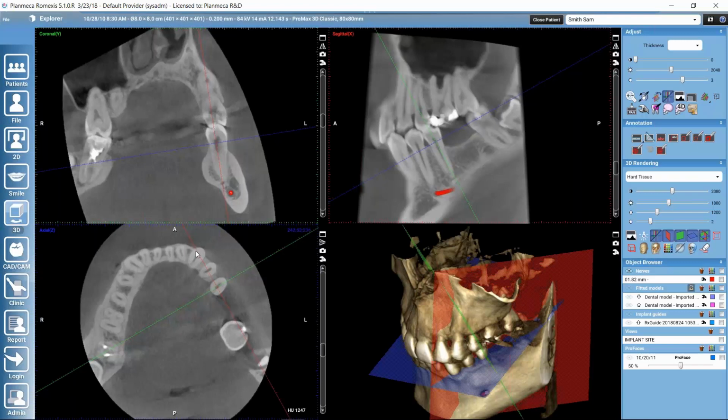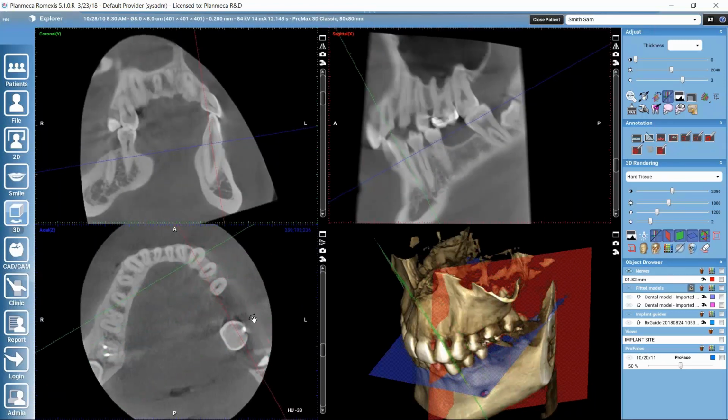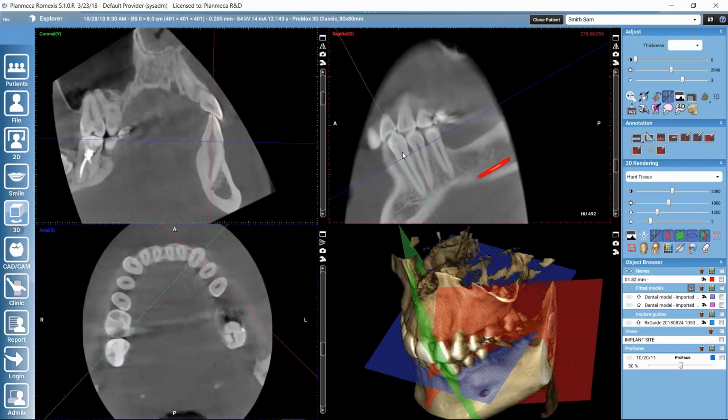So firstly, if we would like to go back to some specific place in the volume later, so if we find something interesting somewhere in the volume and we want to find that place later, naturally, like I said, we could make some annotation and we could go back to this view by clicking on the annotation here, but we can actually also just save this position here.